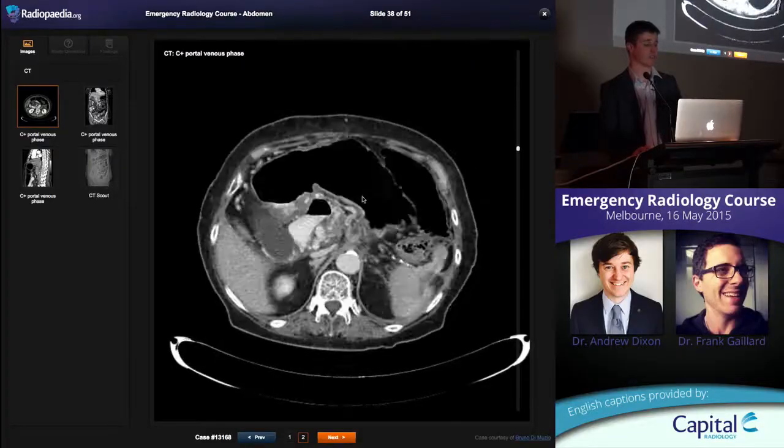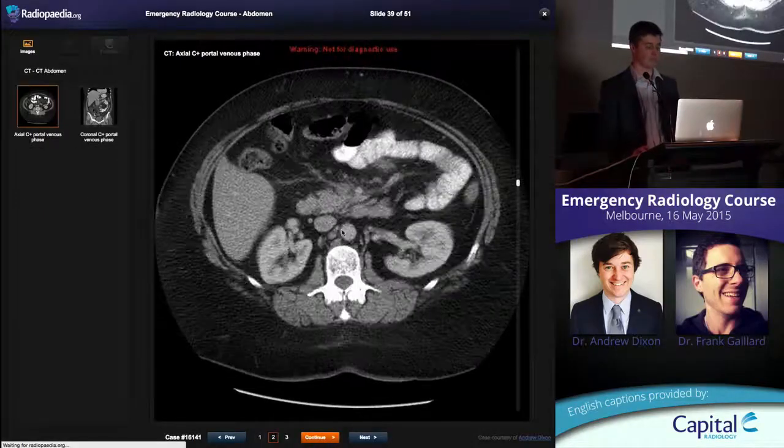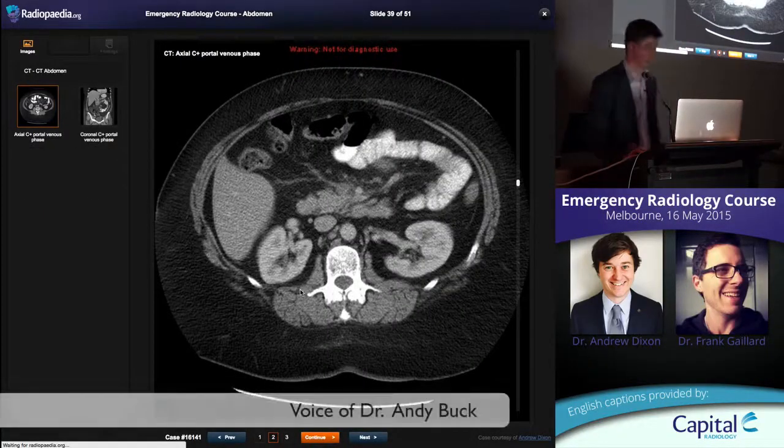So this person is pre-terminal. Your bowel's dying, the patient's probably not far behind. Let's make one comment about the ischemic bowel, Andrew.